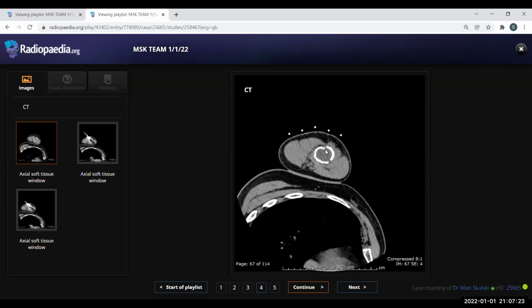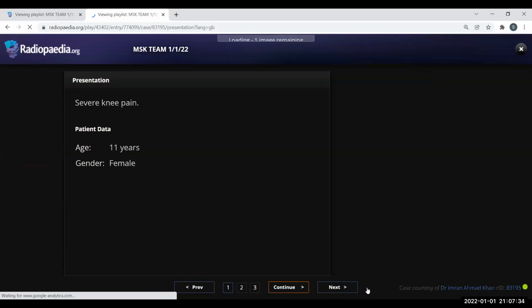I think it is unfair that this is not scrolling. Let's leave this. I'll just go to the next case. Click next. Okay, we'll just stay on the X-ray. Okay. Good.